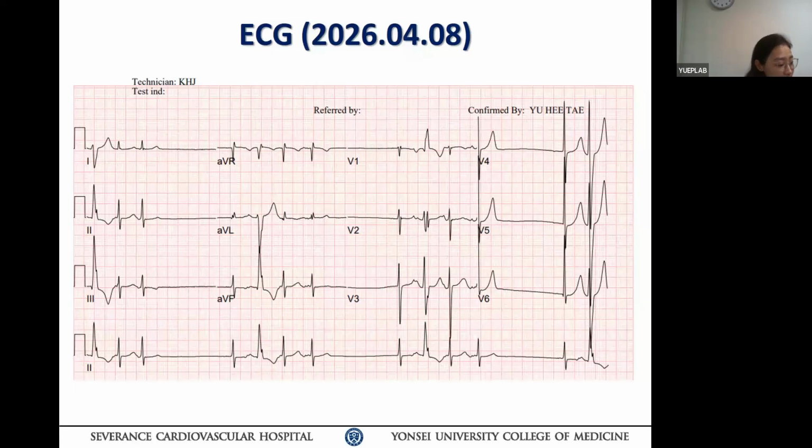Okay, so Dr. Chair, I'll ask again. Is this the PVC or the aberrancy? Aberrancy? If you continue to insist PVC, I can ask for voting. Okay, then please summarize, Dr. Zhang, all interpretation of the ECG, and please imagine the cardiac condition of this patient. We don't have any information about the age, sex, and what kind of structural heart disease, but please imagine.